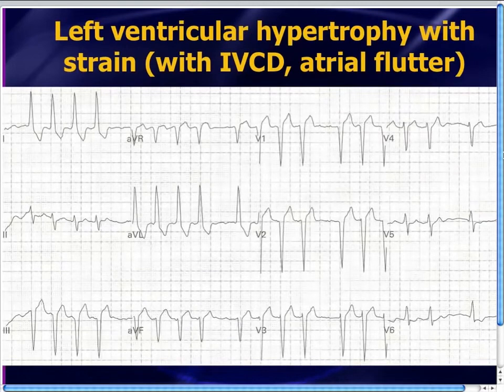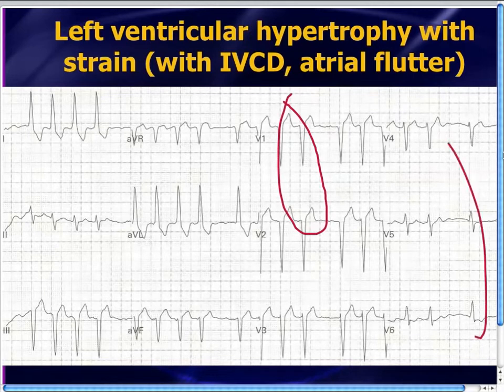Here's another example. Once again, forget the rhythm. Just take a look at the 12 leads. There's ST elevation out there, so you wonder, is this a septal STEMI? And in this case, the lateral leads out here look okay, but 1 and aVL show flipped T waves and ST segment depression. That's a tough call.